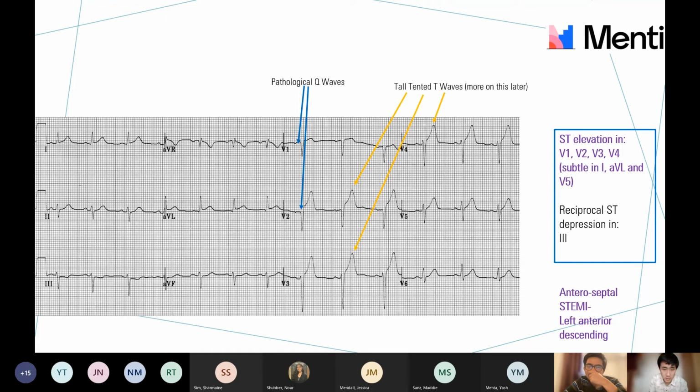Okay, one of you has described it. Just in the interest of time, because I know we're getting to an hour soon, I will give you a 10-second countdown and speed through the rest of the slides. To be fair, ST elevation and depression is definitely very high yield, so I'm glad we've covered this properly. Okay, let's close the timer. Let's have a look at what you've said.